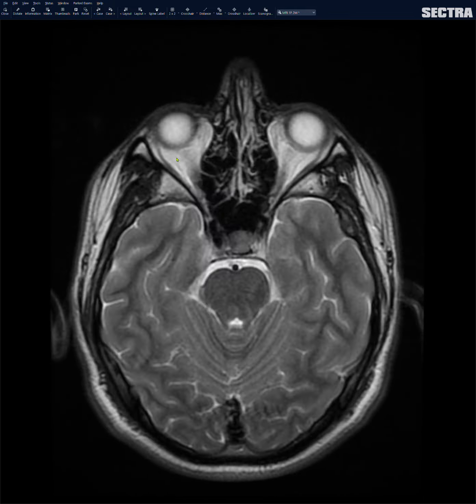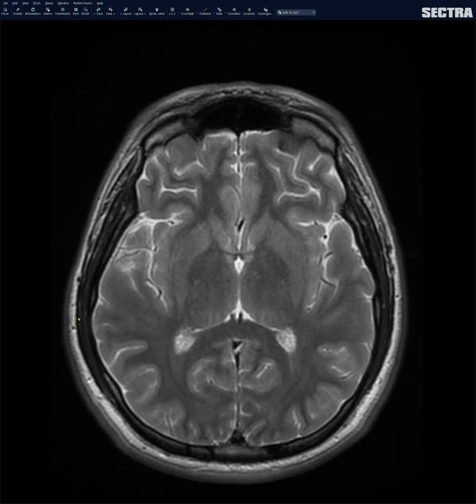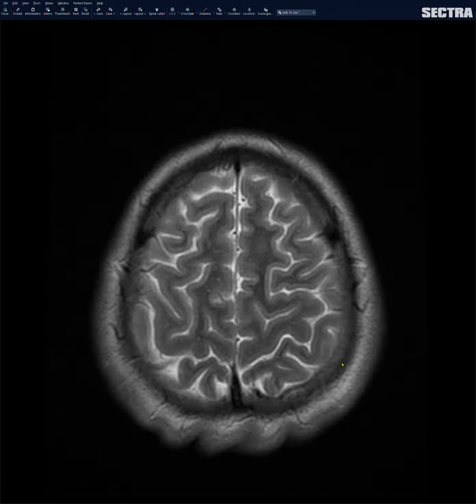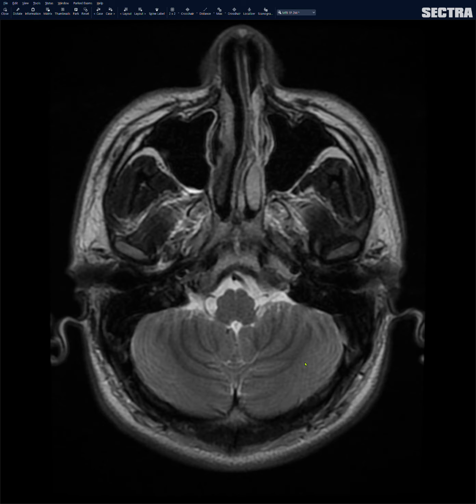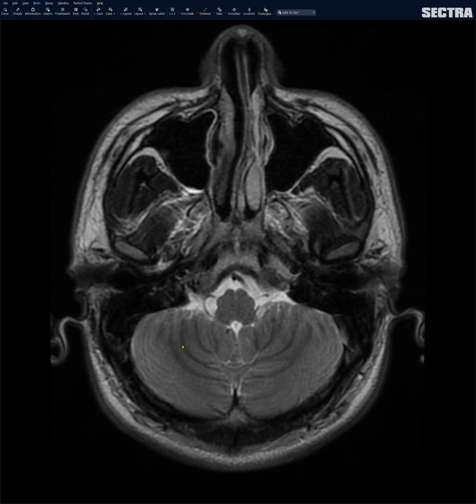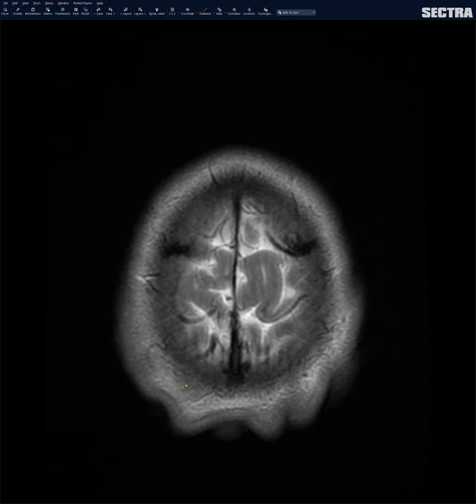So I look at the right frontal lobe, the left frontal lobe. I look at the right temporal lobe region, left temporal lobe region, work my way up. Look at the left parieto-occipital lobe region and the left cerebellum. And look at the right cerebellum. And again, sometimes you can catch these little tiny lacunar infarcts in the cerebellum that you can't really see on the T2 FLAIR, but you can on the T2. Okay, and then look at the right parieto-occipital lobe. Great. And after that, I look at the soft tissues on the T2.